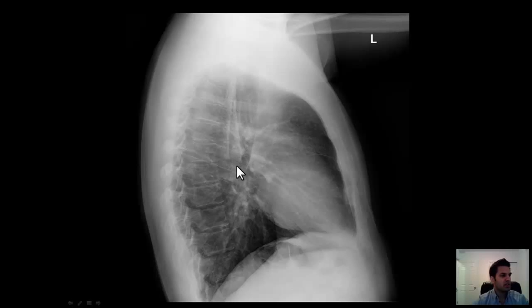You can see the trachea. Sometimes you can see the esophagus. Sometimes you can see the aorta. You see the hilar vessels and all these vessels on end. You can see the heart nicely. And then finally, you can see the lung fields again. So the lateral view really helps you localize what you see on the PA view, and helps you put it into the right area.